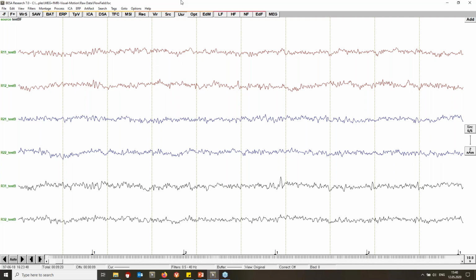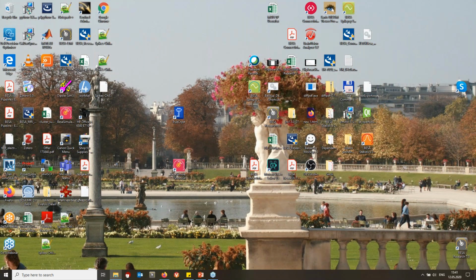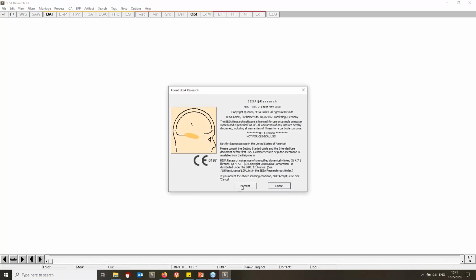talk about. There's one more thing I would like to show you, a glimpse of what we've been working on recently, and that will bring me to a similar topic. So talking about source montages, virtual sources, virtual sensors, and also brain atlases. So let me close this program and just want to show you, this is the beta version of our latest release that we are currently finalizing.